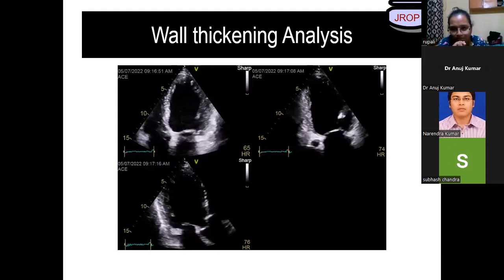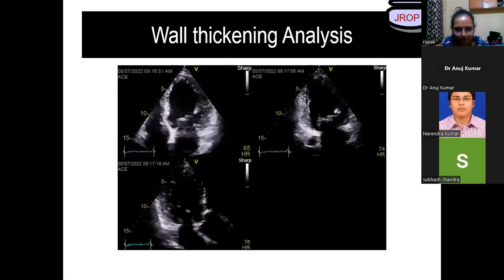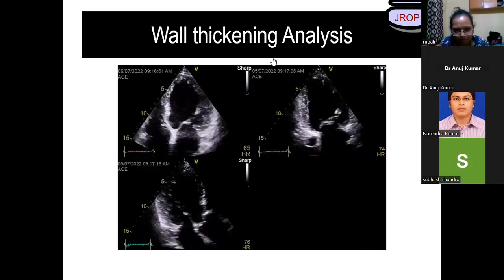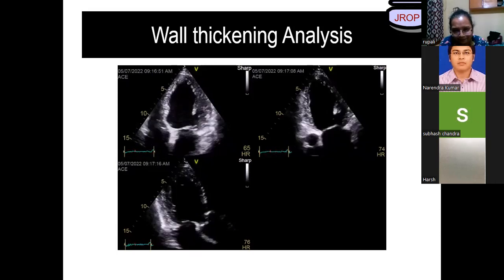Okay. But the basal septum is only the basal septum. I think it is akinetic because it's thin. Perfect. The basal septum which is akinetic. Yes, thin and very akinetic. Look carefully. This is the only segment which is akinetic. Yes, sir. And if you add hyperechoic, thinned out, it'll give you more marks. Yes, sir. Okay. All right. Good attempt, Rupali. We'll hold it over there.